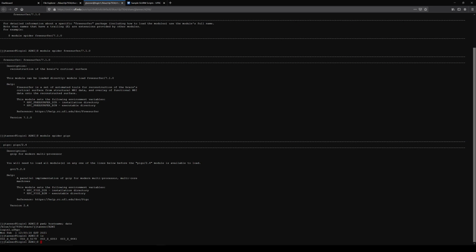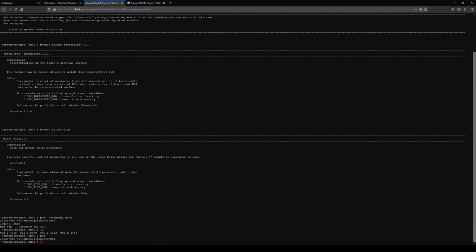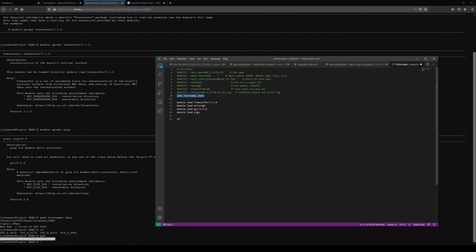We have these 4 subdirectories, and we're going to do some processing in these. So we're going to be ready to go. I'm just going to type pwd, and then copy and paste that. Using this online terminal, it automatically copies when I highlight. So I'm going to copy that, come over to my script, paste that in. But really we're going to go to this first one.